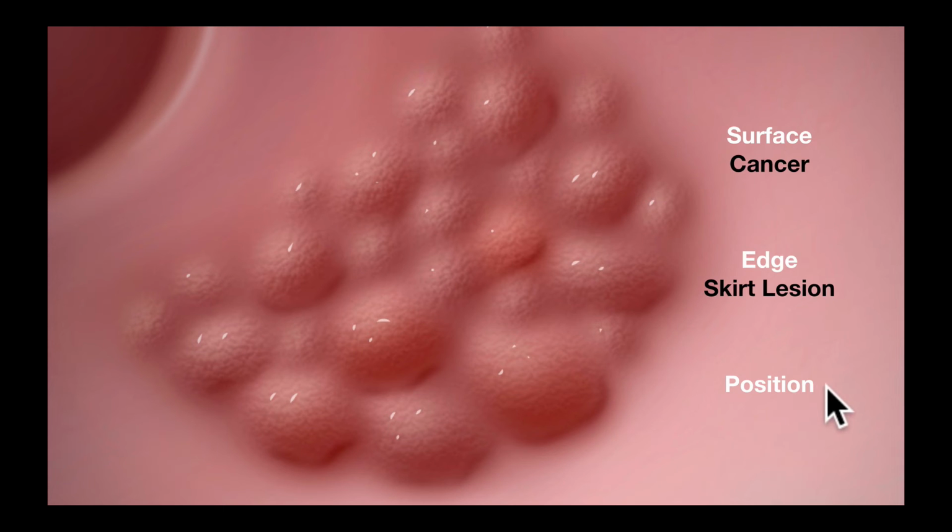Next, we look at the position of the lesion in relation to gravity, whether it is dependent or not. If it is dependent, and if you resect, and if there were to be bleeding, it will be very hard to find that bleeding spot as the blood pools in there and you cannot find the arterial spurter.